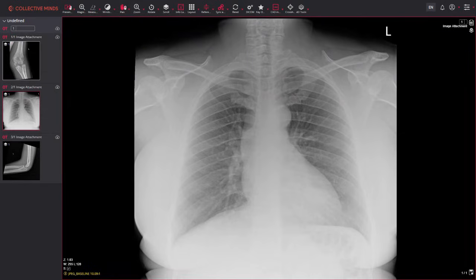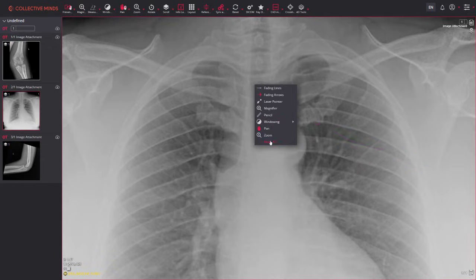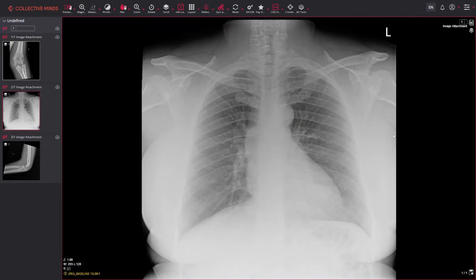Is it rotated? Well, there are things that we can do to assess that. So if we look at this here, we can look at the distance here between the end of the clavicle and the spinous process. Now, very, very minor difference on each side. There's slightly longer distance on this left side, but essentially very minimal rotation there. We can also look at the posterior ribs. Do they appear similar length, similar appearance? Which they do. So this patient isn't really rotated either, which is nice. This is a good chest x-ray.